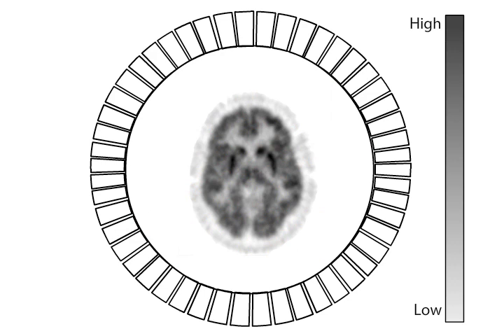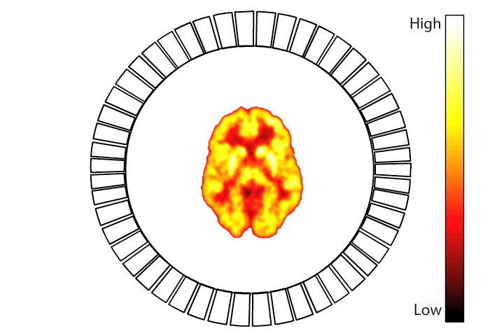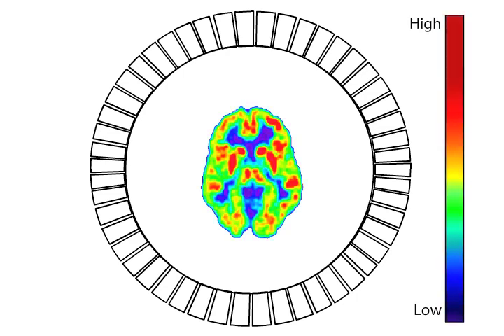Researchers can also apply artificial color tables to the PET scan, facilitating the identification of regions of high activity. Note that these color tables can be either linear, for example from light to dark, or nonlinear, where hotter colors are used to indicate increased activity.